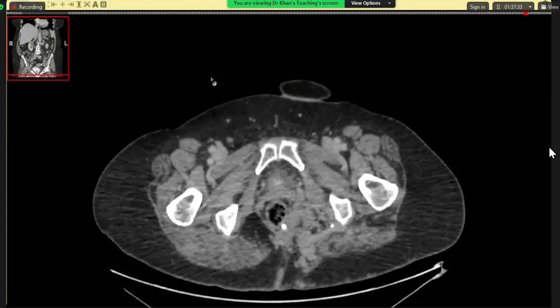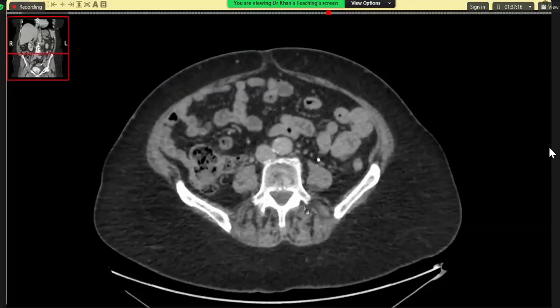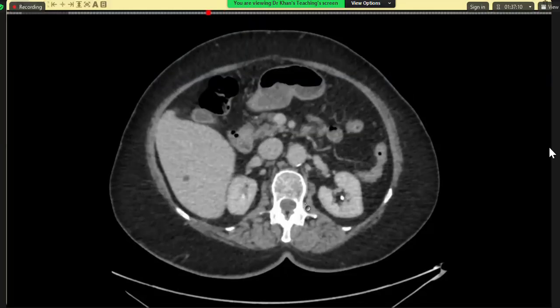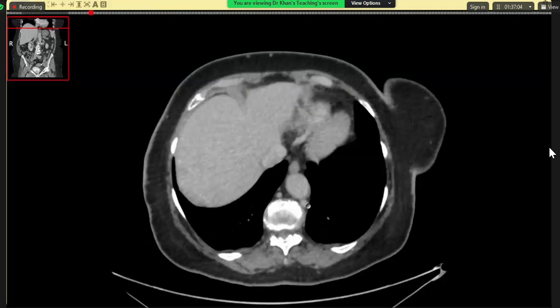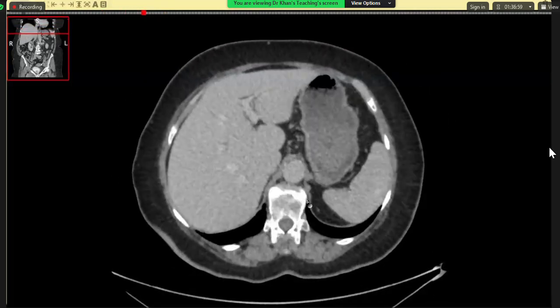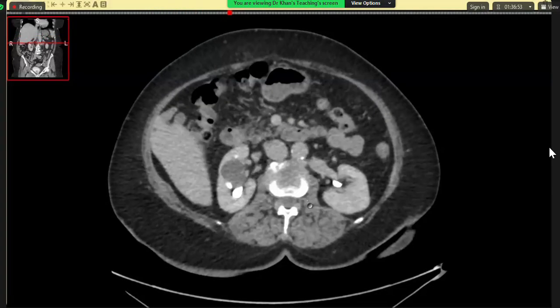So this was a 75-year-old female who had previous stones 20, 30 years ago, and the patient presented with hematuria. Ultrasound was normal. They asked for a CT urogram. I'm showing you an excretory phase of CT urogram. Concentrate on pelvis, please. I'm interested in the pelvis. Okay, sir. I'm provided with the CT scan axial, this pelvic, is an excretory phase of a CT.